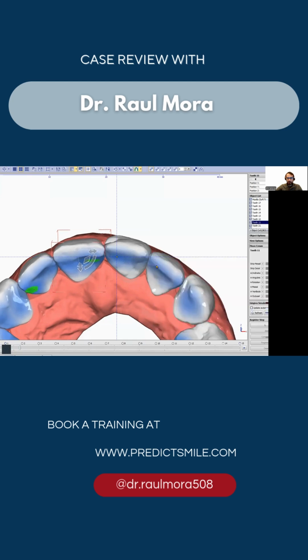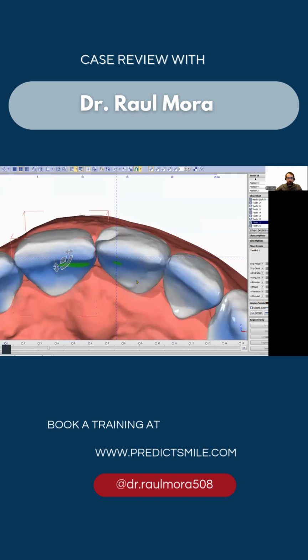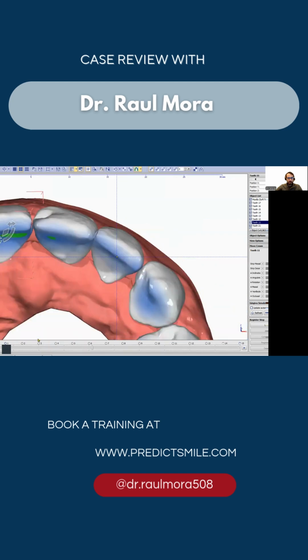So now I have delayed the movement and it's not going mesially buccally. You see it starts moving at aligner 3, and we can even make the pause a little bit longer, but we're going to have problems with the other lateral incisor.